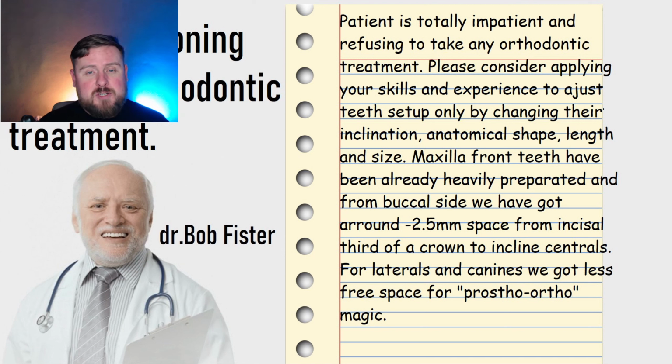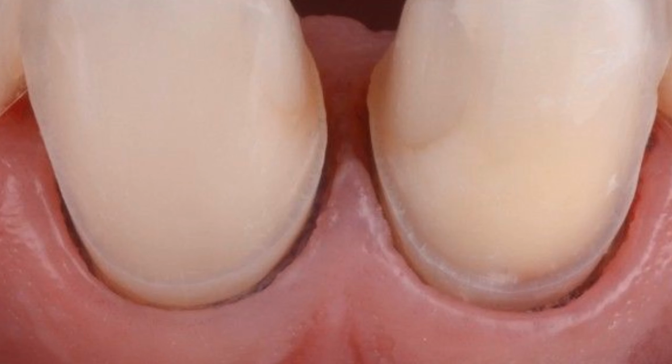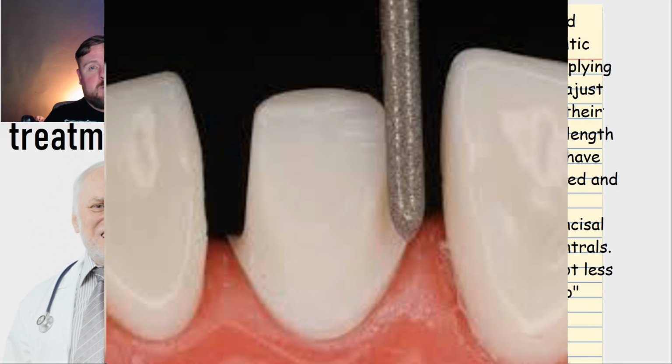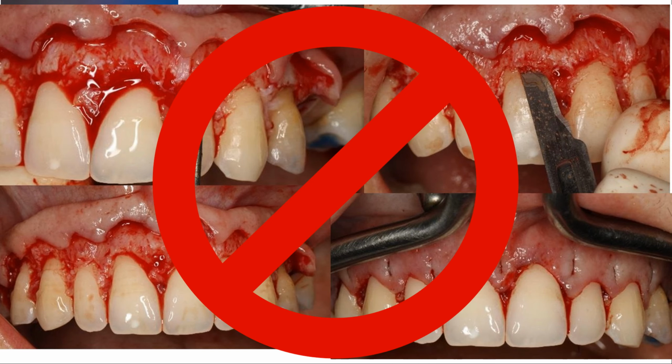So, teeth positioning. You can play with anatomical shape, but do not change the cervical side next to the soft tissue. Do not change it because all the preparations will be paragingival and not subgingival, like 2 millimeters or something, and no gingival surgery. No gingivoplasty.